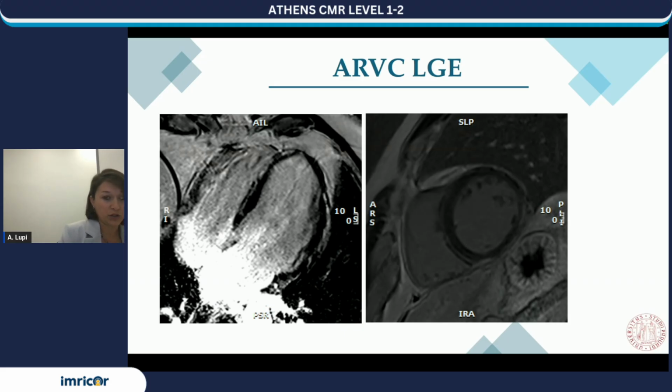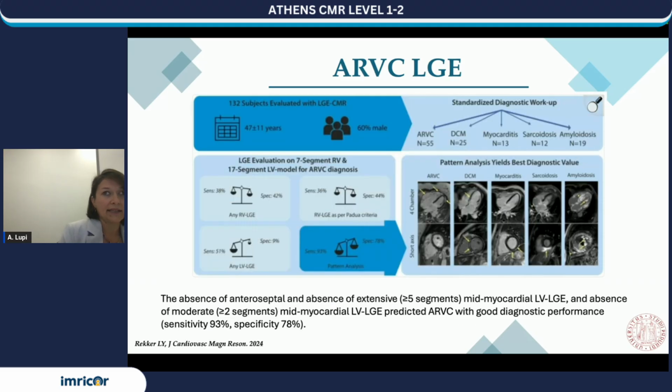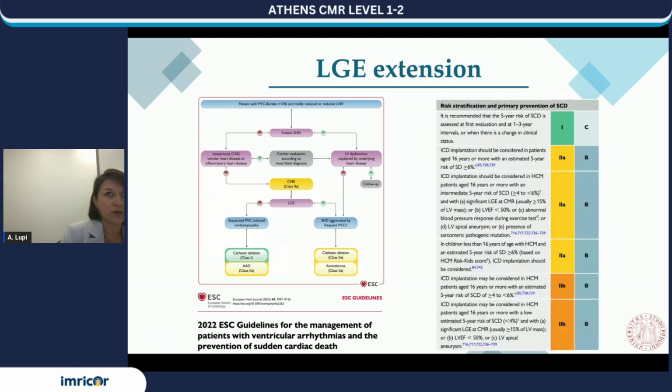Here I show some examples of the high power of LGE assessment in those patients. And this is to show you the prognostic value of LGE in arrhythmogenic cardiomyopathy.